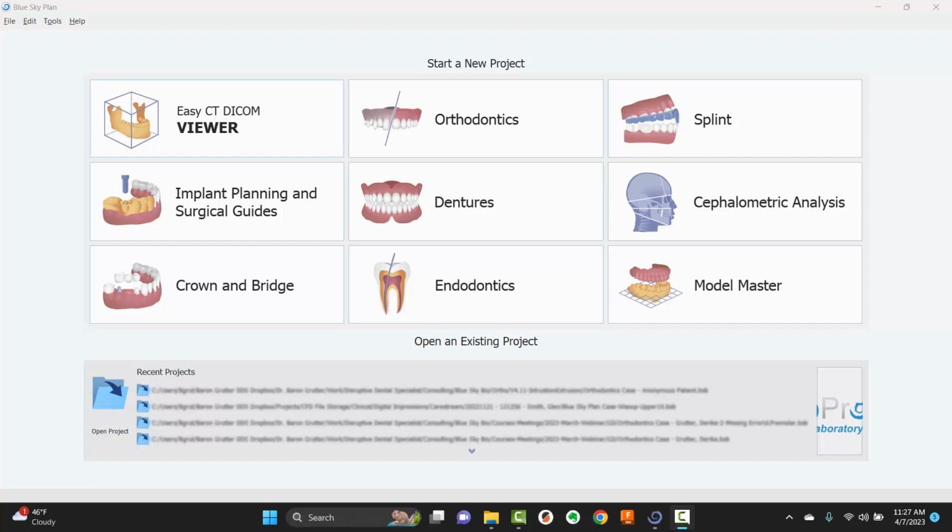Anyway, this video is going to be an update on the orthodontic module as it relates to clear aligners and some of the bigger updates in the software as it stands. I actually already recorded this video about a week ago, maybe a little longer. Anyway, it ran on way too long. There's so much to potentially cover, and I struggle sometimes without sticking to the basics.